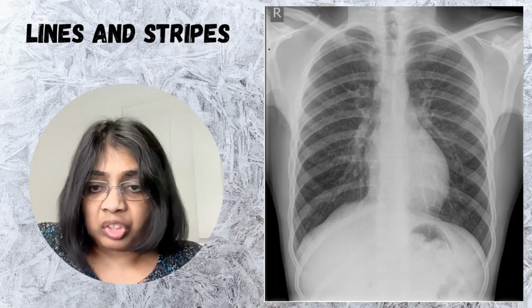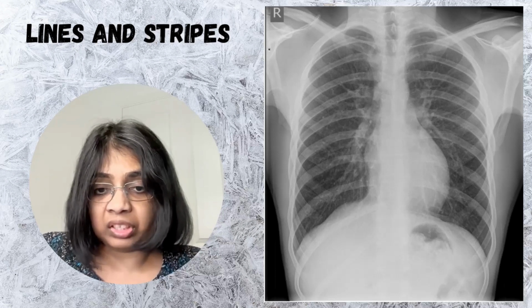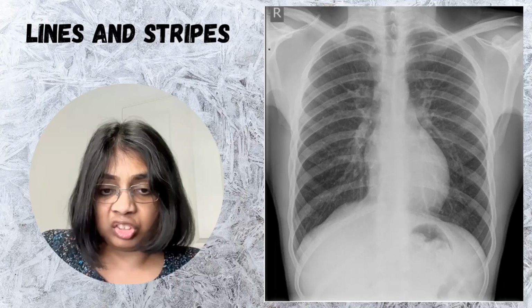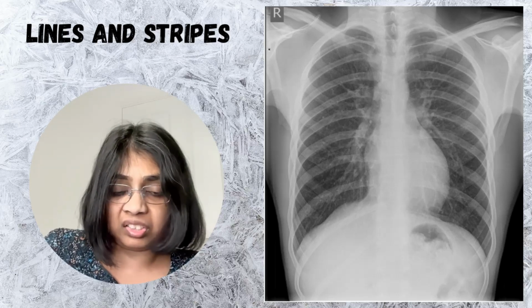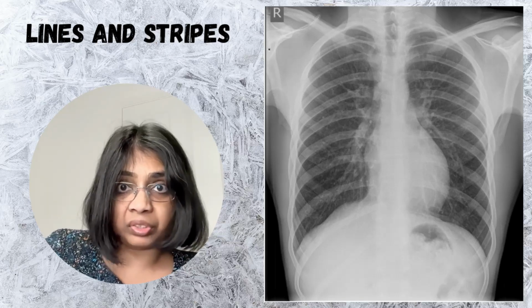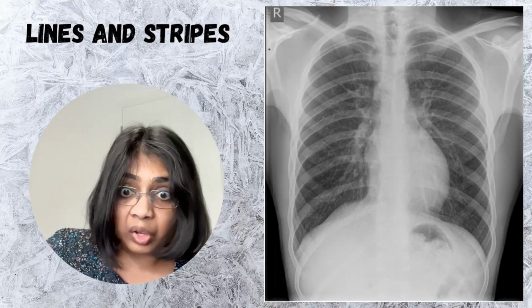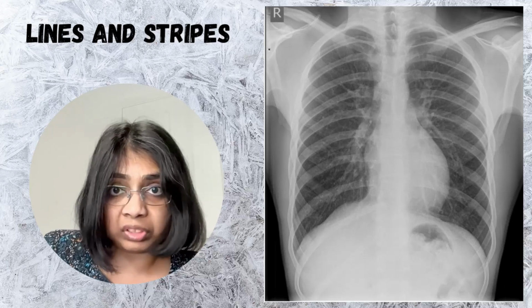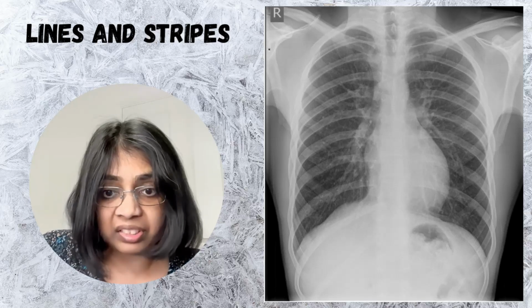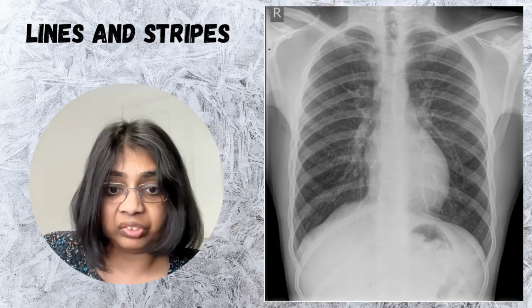Other things to remember: the extent of the lungs is not just the lucent area on the chest radiograph. In fact, medially, the lungs extend to the posterior junctional line and extend inferiorly, with the azygoesophageal recess being the border, and extend below the diaphragm. So it is important to look at these areas when we're reviewing a chest radiograph, because pathology can be missed if you don't.